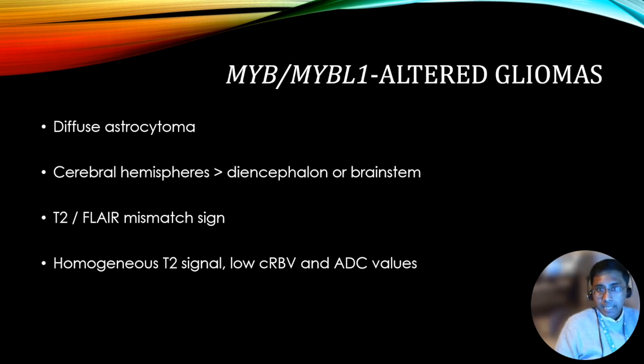Again, it falls in the subcategory of diffuse astrocytomas. The cerebral hemispheres are more common in location than the diencephalon or the brainstem. As I said before, T2-FLAIR mismatch is one of the typical features for the same, and a homogeneous T2 signal, a low CBV, and a low ADC value would be in keeping with this tumor.